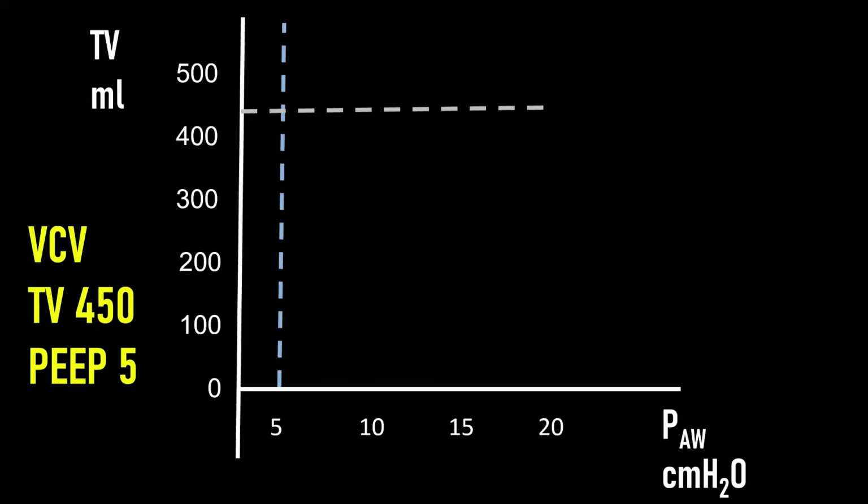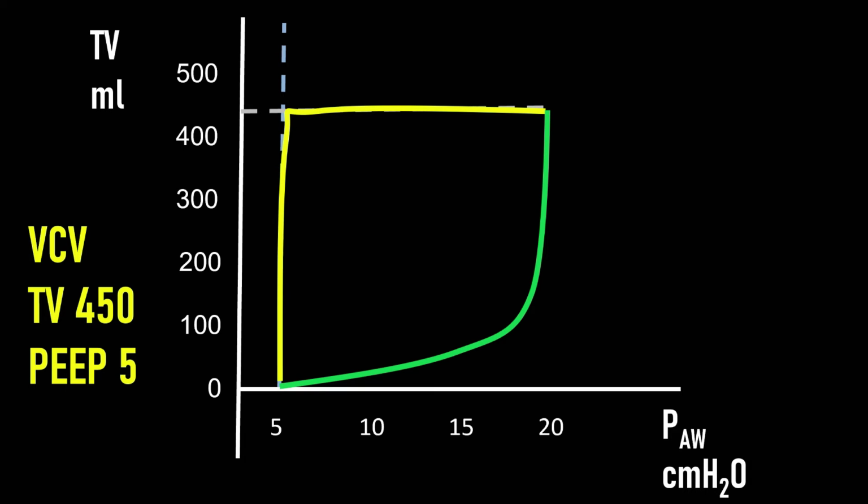What about this picture? In this example, and remember this patient is on volume control ventilation, the initial inspiratory flow is very different from what we've seen before. Instead of going directly upwards, it's kind of rolling outwards, a bit like what you see in pressure control. It goes up to the airway pressure and then really slow to resolve.